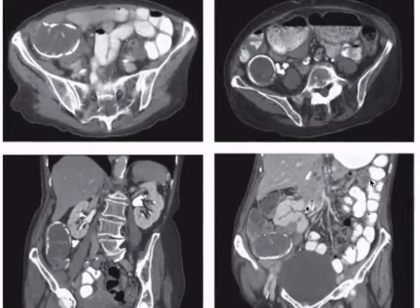The process of calcification can go on to the extent, as in these cases, where it becomes what's known as a porcelain appendix. Be very careful not to confuse this with a low-lying porcelain gallbladder.